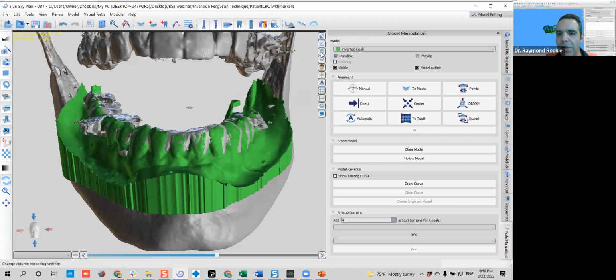If you can see now in this version, you have this small face that is like a radio opaque skull and whatever. This is just the volume rendering settings, okay? So you left click on the volume rendering settings, and then you just check out the rendering.